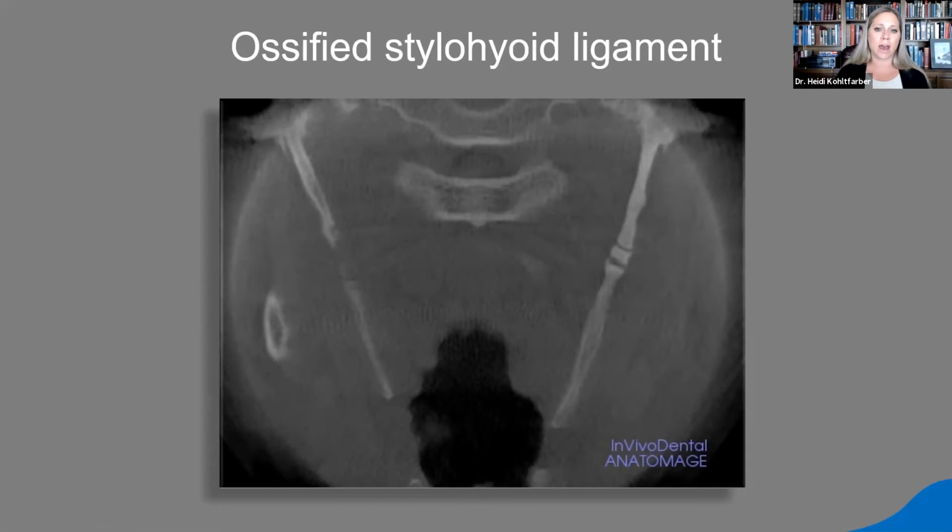In a patient that reports issues such as fainting if they turn their neck, or pain if they turn their neck, they're talking about an actual true anatomical impingement. Because it's such a common appearance to find the ossified stylohyoid ligaments, we typically will look at the health history to see if there's any symptoms before we try to put that together for Mrs. Jones. Because if you tell her that this could be associated with Eagle syndrome, of course, she's going to Google that and she's going to be sure that she has it.